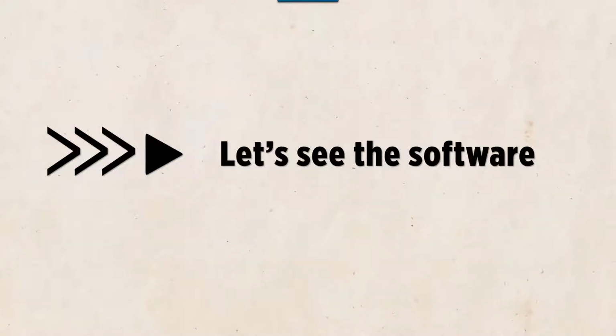Now it's time to show how this works, and I want to keep this presentation from being dry as a bone, so I will show you the software.